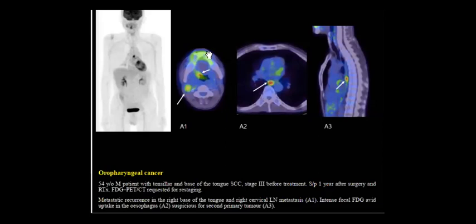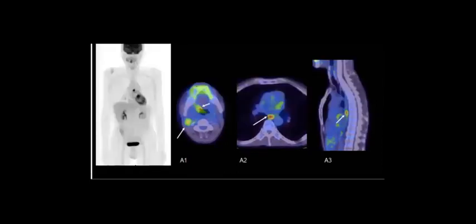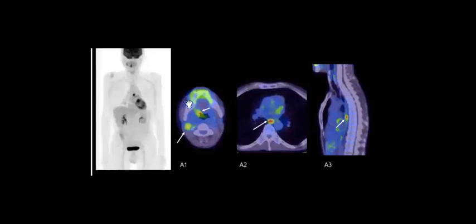Sometimes if this patient has an infection or something similar, it can show this high uptake. Also, if he uses his mandible, the muscles of mastication or any surrounding muscles can have similar uptake, yes.